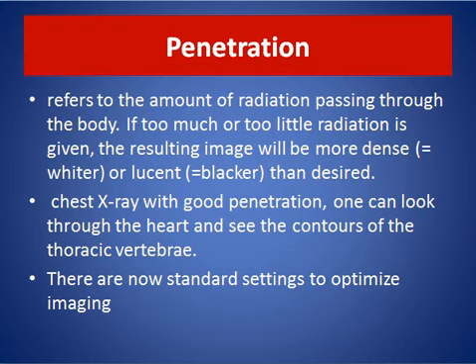In a chest X-ray with good penetration, we can see through the heart and see the contours of the thoracic vertebrae. And nowadays we use optimized settings for the penetration, and we use digital machines, and it is very good, and there is no over penetration in more than 99%.